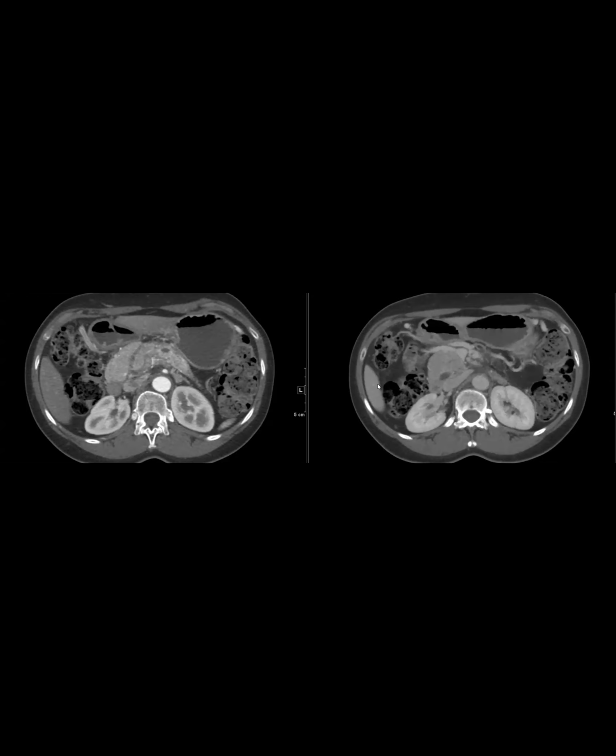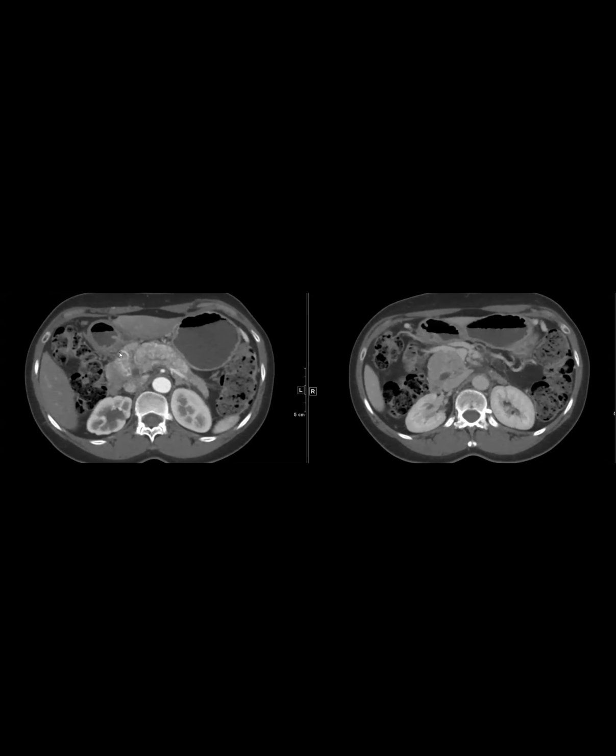Anyway, so this was just a cute case of malformation and this very unusual appearance of the neuroendocrine tumor. Yeah, Victoria, I like that case because people often think neuroendocrine has to be a small, rounded, enhancing thing, but sometimes it really just infiltrates and takes over the whole pancreas.